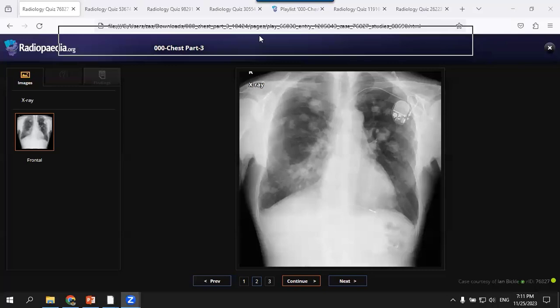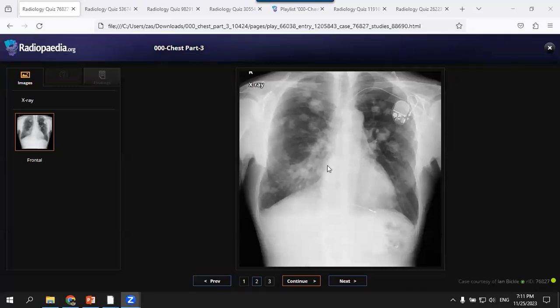So my interpretation for this case is multiple bilateral lung masses, one of them appearing cavitating. My differential diagnosis could be metastases. I will correlate if there is any surgical clip within this image. Also, I will review the record of this patient. Second, I want to see if there is any history of septic emboli or previous pulmonary embolism. It could be one of the differential diagnoses.